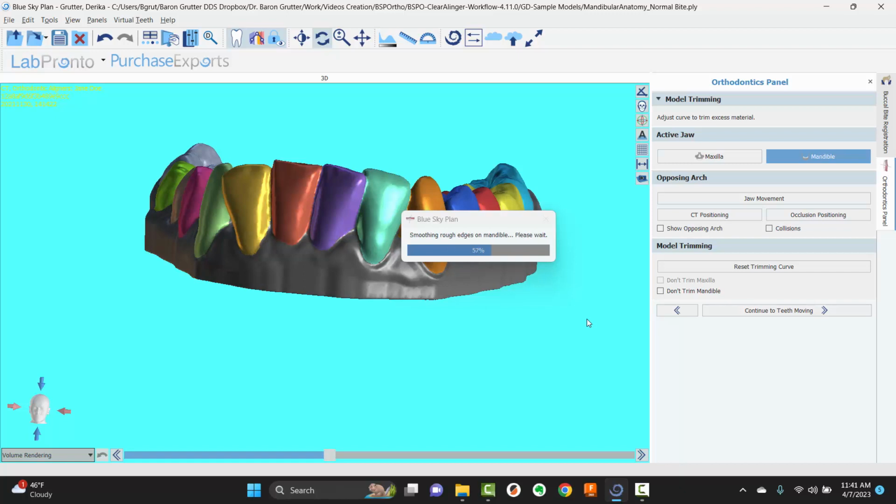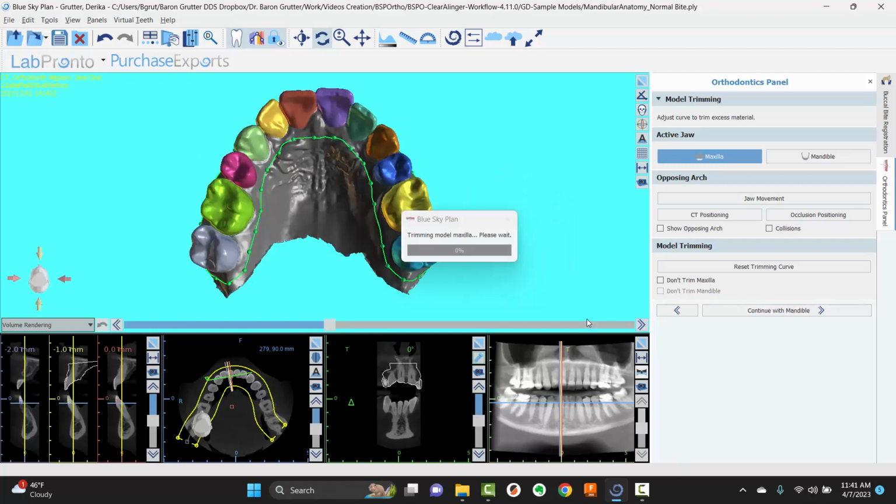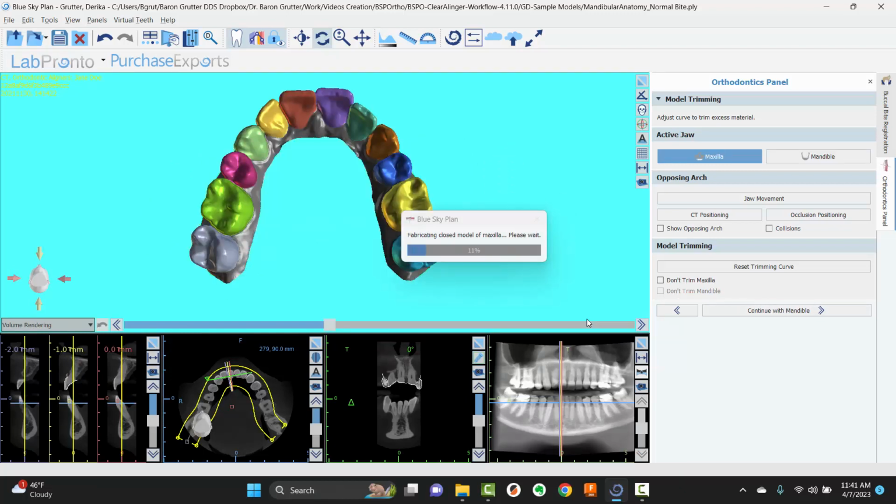That's going to take more resin when printing. It's going to stretch your trays a little more when you're making them, which means the resultant tray is going to be slightly thinner. So that's something to be aware of. There are quote unquote consequences to having really tall models. They print easily. There's some benefits to them, but for the most part, I think most of us would agree the shorter the model, the better when we're going to be printing a bunch of models.